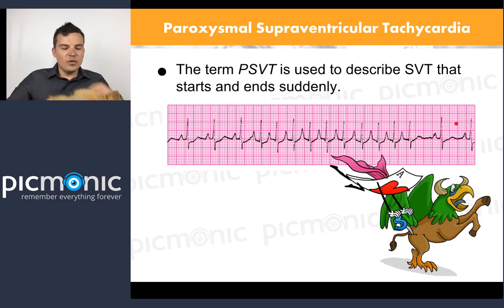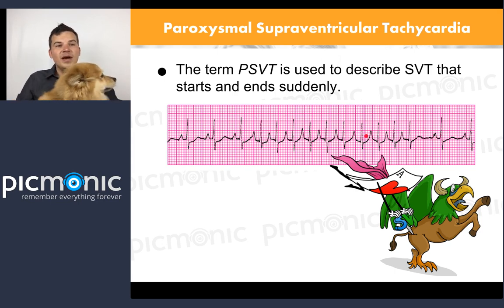It did some craziness in the middle, and then it just got back to normal again. We see this again when we talk about a ventricular rate. But it was doing great, then it got drunk here in the middle, and then it did crazy stuff, and then it goes back to being normal again. That's the point. There's just this madness in the middle, and that's what we call paroxysmal.